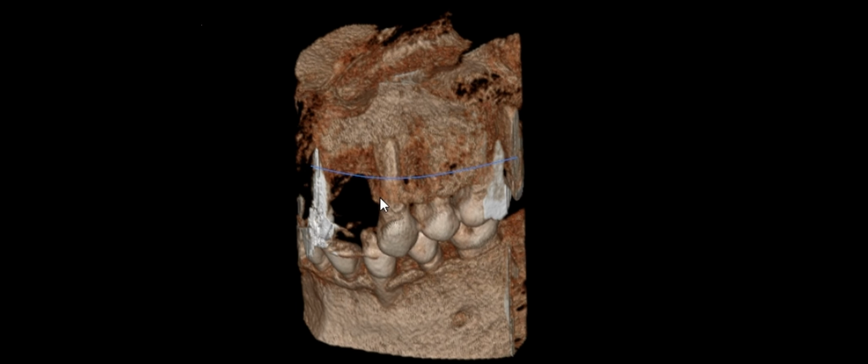And further again, if we move over to a different section, you can see the outline of the native bone, which is a little bit darker, and we have the grafted bone, which is nice and dense in this area here. And much the same on this image here, you can see good bone level and a dense grafted bone occupying that space.